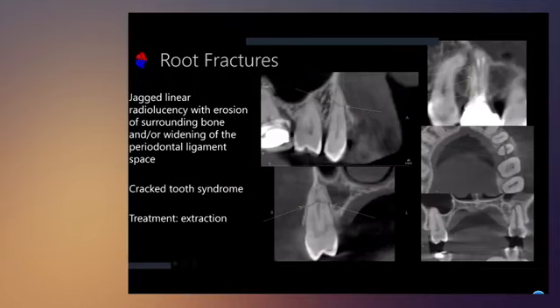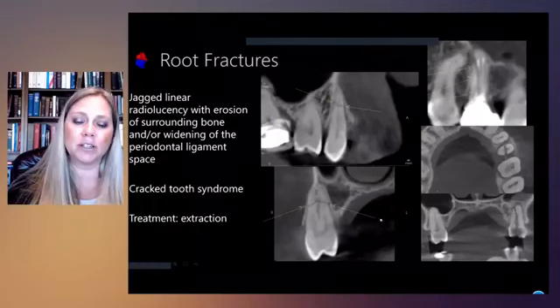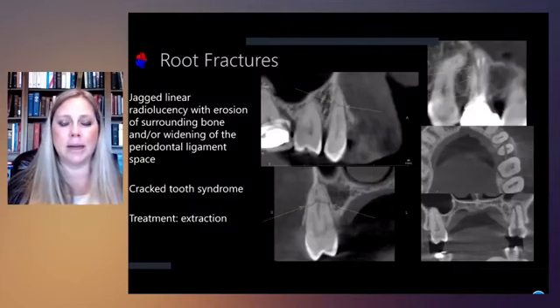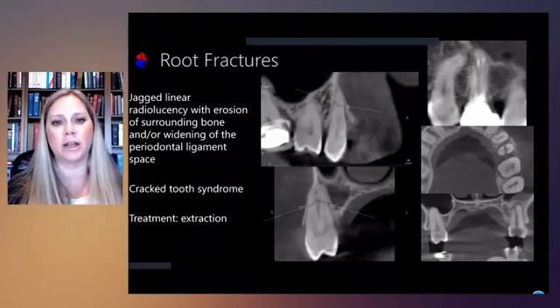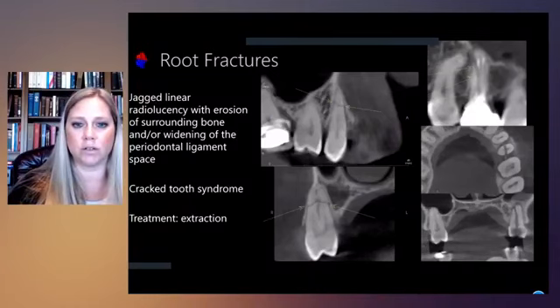patient. Now, obviously, a tooth such as this, you can obviously see the huge displacement. You're not going to miss that very likely. But this was an interesting case in a patient that was completely asymptomatic, and yet we have a nice root fracture. Now, obviously, these patients will come in with a cracked tooth syndrome. Most patients will have some type of twinges and feeling when they're biting down, so we've got some percussion sensitivity. And obviously, all of these teeth here are going to need to be extracted. They have a very poor prognosis.